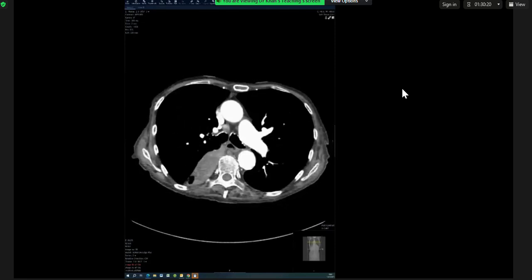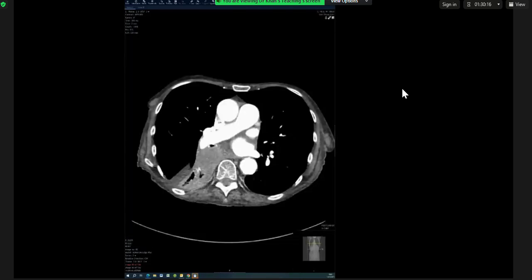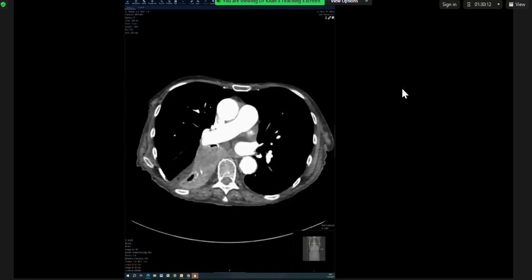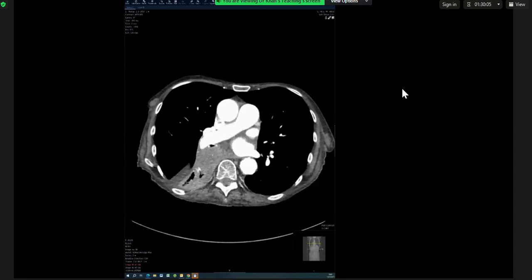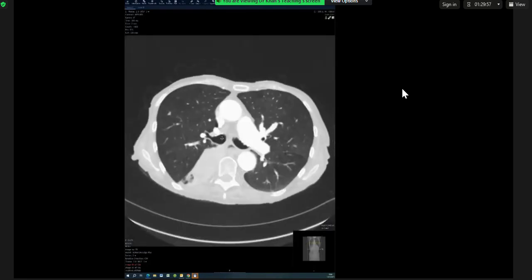And the contralateral one, this one is the MET. So this tumor, when possible, we want to access tumors endobronchially, and this one is a prime example. This can actually be debulked. So when you say this, if this was actually benign, this patient still needs a bronchoscopy because there's something occluding that bronchus causing collapse. So they need bronchoscopy regardless.